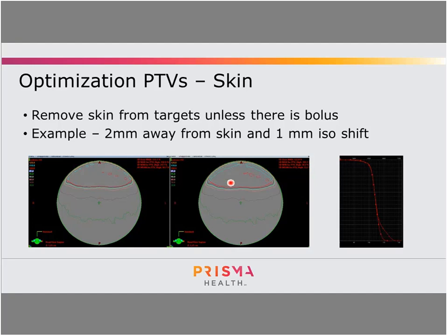So again, it's having to put a lot of dose tangential to this target, which you don't see at all in here unless you go through and look at the segments. So this is just something to think about. If you're wanting to treat the skin, you really need to use bolus.